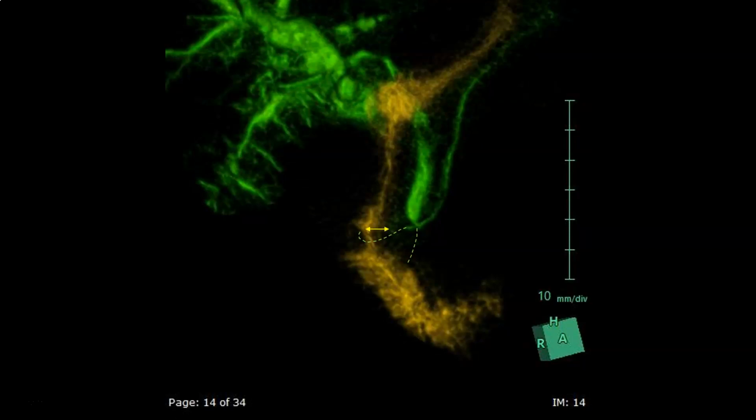What happens is that the narrow part of the duodenum, when it is stretched by the passage of a food bolus, will stretch on the accessory duct of the pancreatic annulus, and this will tighten the compression exerted on the lower part of the common bile duct and will cause this transient stagnation of bile in the extrahepatic and also intrahepatic bile ducts, inviting stone formation and infection, ultimately leading to biliary cirrhosis after repeated attacks of cholangitis.